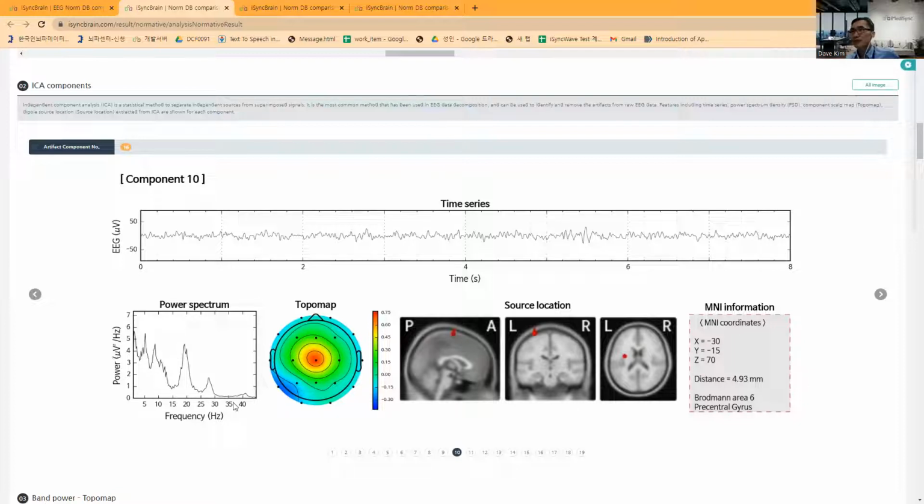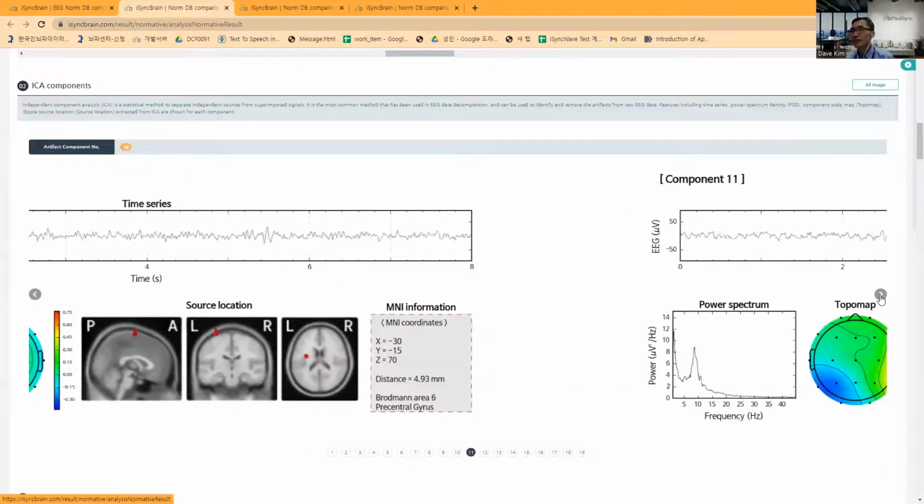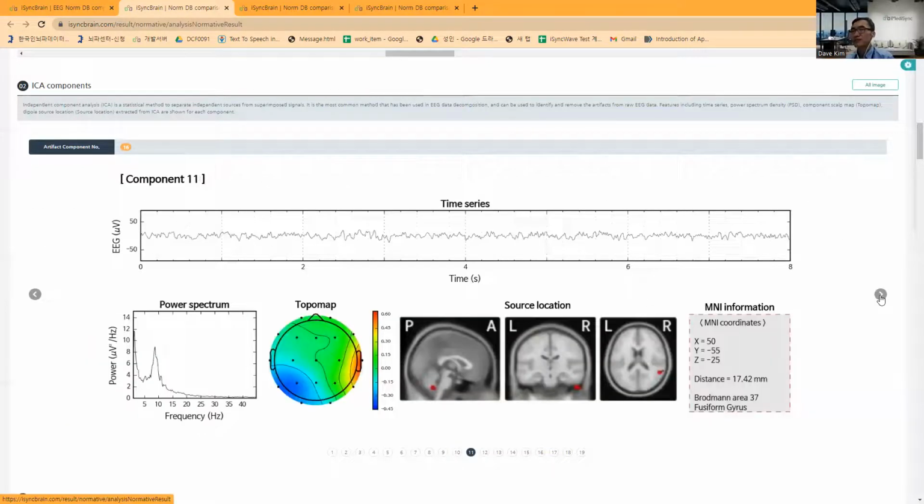Very complex EEG sign. I think she has a high-speed alpha frequency coming from her psychotic symptom, and the slow frequency activity in the frontal area coming from the dopamine down-regulating medication for relieving the schizophrenia symptom.